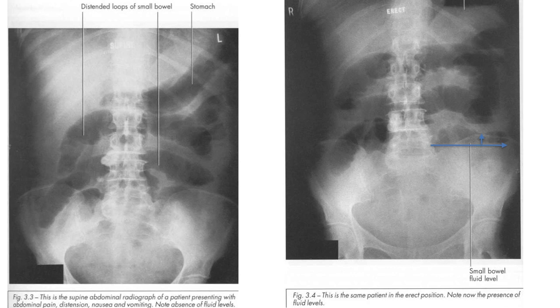Let's go and check again. When you have a patient with bowel obstruction, it can be paralytic or mechanical obstruction. So you have to request the abdominal ultrasound and the abdominal X-ray at the same time. The abdominal X-ray includes supine, erect and lateral decubitus.